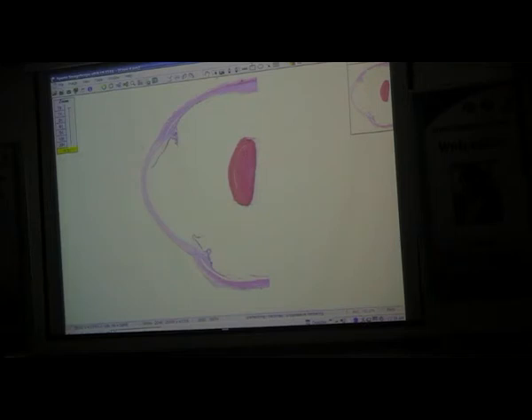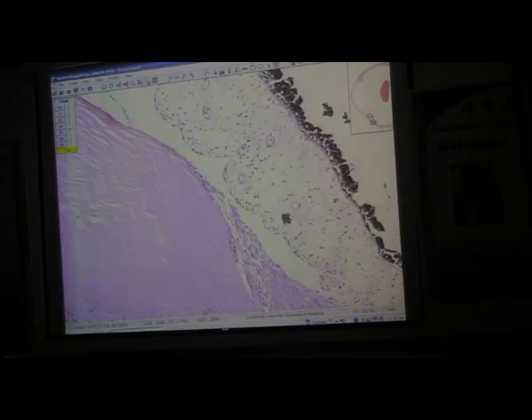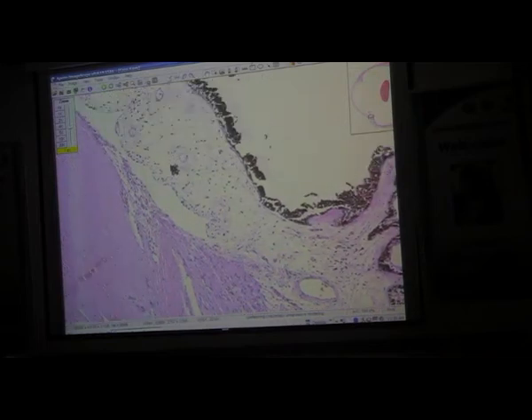Again, if you were doing gonioscopy on this particular eye, would you have been able to see the scleral spur? Yes, no? No? All right, so we need to find out why the angle is closed. And a very, very quick case. We'll come up over here. We will look again at this case. And you can see it looks like the angle would have been closed, but in fact it was just narrow. You see it? Coming back in here like this.